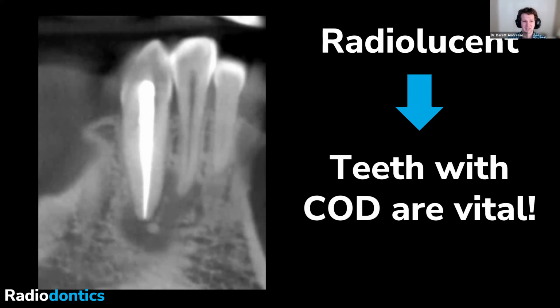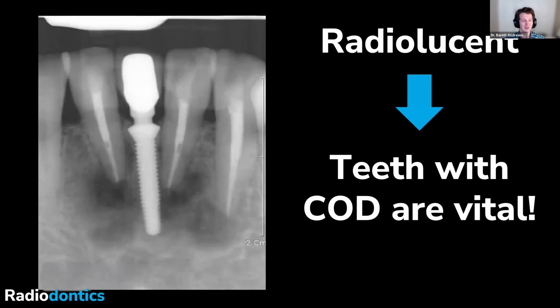We run into quite a few cases where a doctor has done a root canal on a tooth that has what looks like just a radiolucency at its root apex, but it's actually cemental osseous dysplasia. And sometimes they go a couple steps further, and not just one, not two, but three root canals and an implant into not infection, but cemental osseous dysplasia. So not entirely sure how all this happened in this case, but unfortunately for this patient, they did not need any of this treatment here.